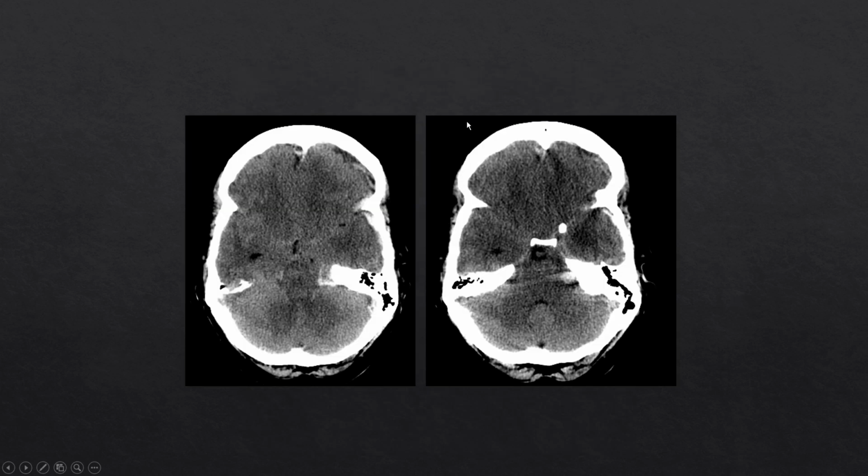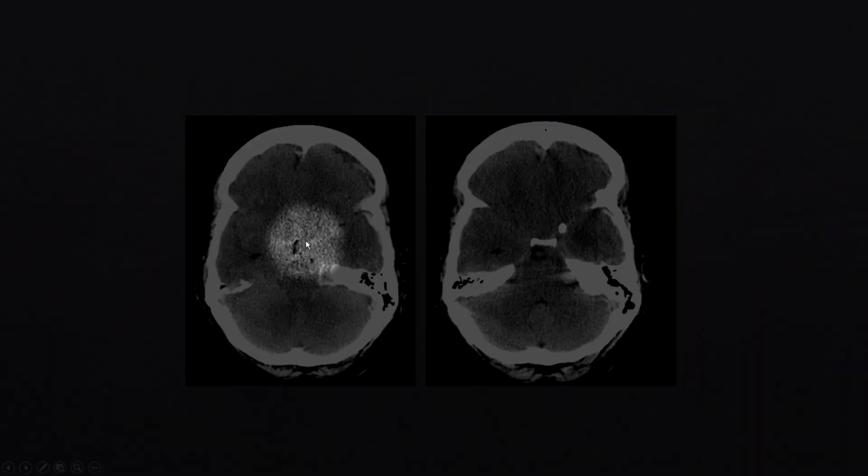When we have hemorrhage, we want to look for any signs of mass effect and herniation. In this case, there's a left anterior cranial fossa subdural hemorrhage and left middle cranial fossa subdural hemorrhage with effacement of the sulci. There's rightward midline shift, and centrally here we should have a suprasellar cistern.